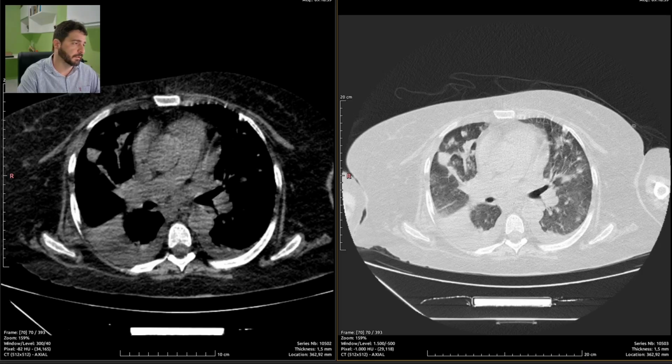So next up is the superior abdomen, also an unenhanced, all shaky and blurry CT scan of the abdomen. So let's go. I have a template for such cases. Of course, I've been doing this for 16 years.